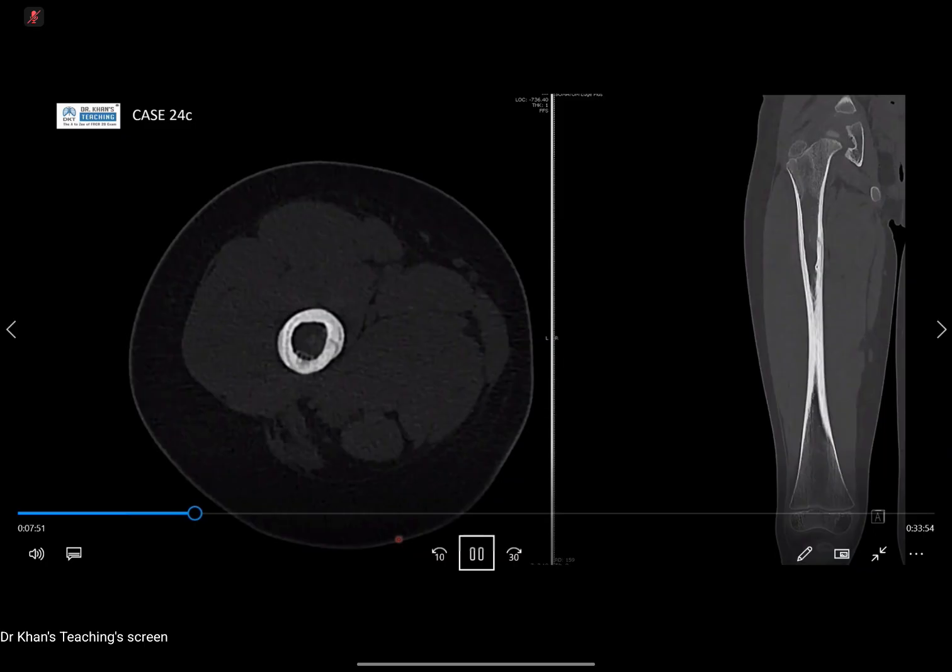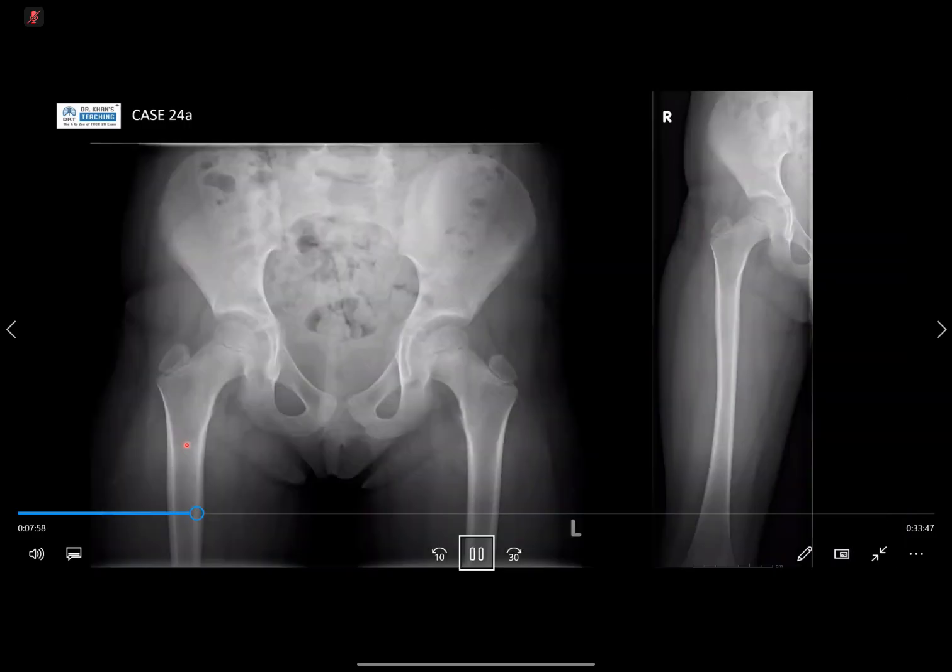Okay, fine, I see where you're going. Let me just go back to that. So we mentioned the periosteal reaction here. Not much in the way of lytic or bony destruction or osteopenia. The bone densities look quite similar apart from that periosteal reaction that we can see.